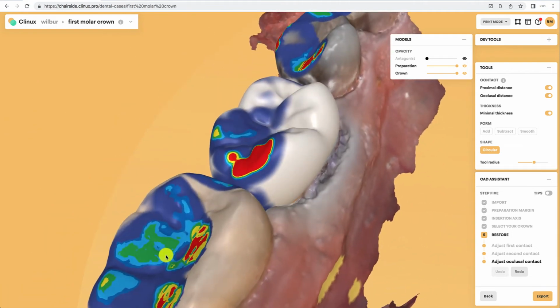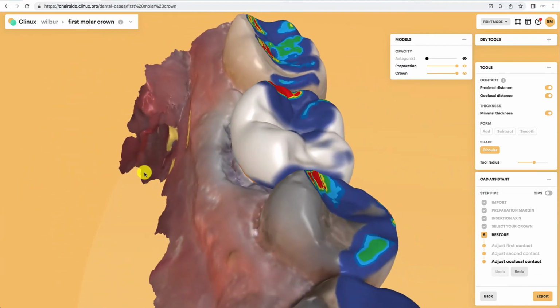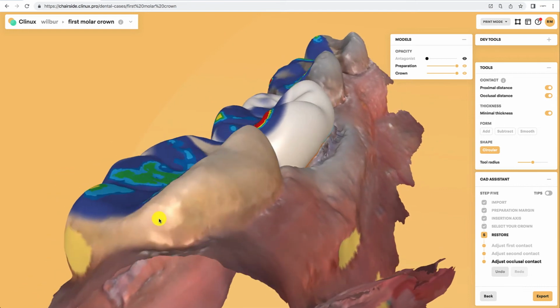So I'm going to take another shot at this, and I'm going to use the tool maybe from a different angle than what I used last time. The angle that you use these tools actually makes a difference, and so you'll find that it becomes intuitive after a time. You get a feeling for when you can use this or that tool and to what intensity and all that kind of thing. So here I like this far better.